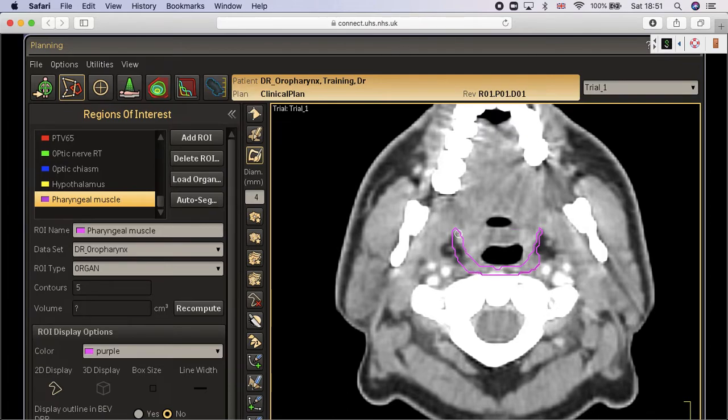Please stick to 2 millimeter. I'm sorry for that. Okay, good. When you look at the MRI, and maybe we can go to the MRI now and try to localize the pharyngeal muscles on the MRI, because the MRI is very nice. You will see that in the midline there is actually no muscle. That's why it's very thin. You can see here there are no muscles there. On either side it's thick, but we have to make it continuous. But honestly, there is no muscle in the middle.